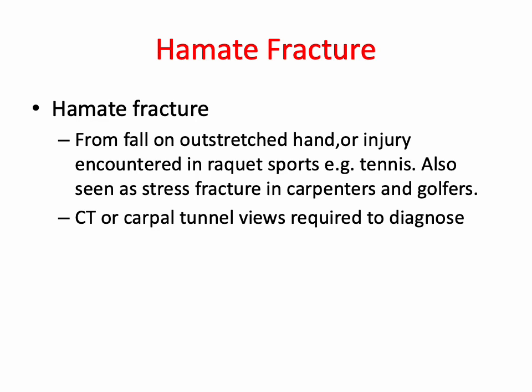Hamate fractures can occur from a fall on an outstretched hand, or can be seen as stress fractures in some occupations, and usually we need CT or dedicated carpal tunnel views to diagnose these.